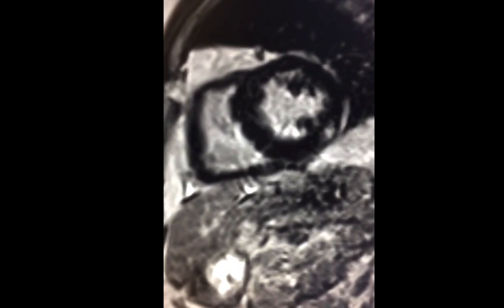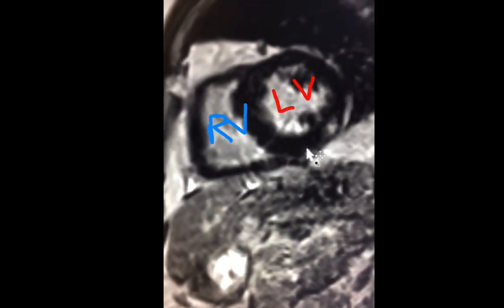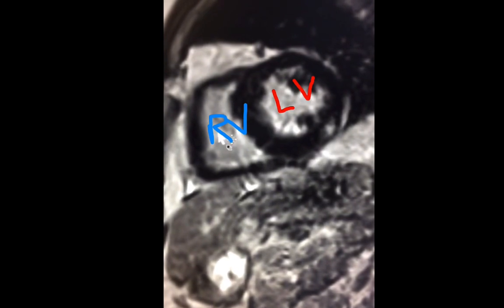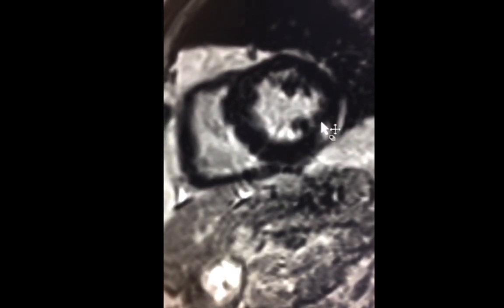Now this is another case for seniors, but hopefully juniors would learn one or two new things. This is an adult male patient who presented with heart block. This image is an MRI image of the heart, and you're looking at the left ventricle in short axis. So this is the left ventricle, this is the right ventricle. The left ventricle looks like a donut, an image that's very familiar if you think about what we do in nuclear cardiac imaging.